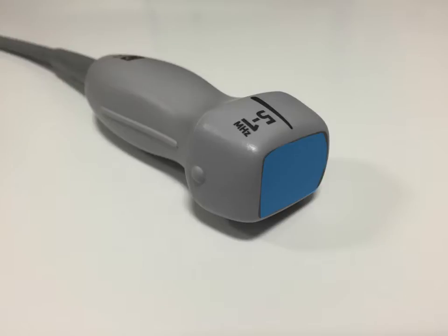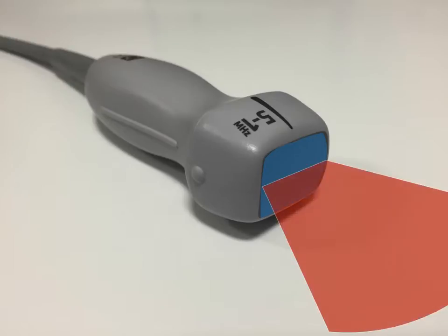So the way that these crystals work is they generate a nice beam. It's very flat and it's very thin, and you see that it spreads out. So it's pretty much in a sort of two-dimensional plane. And some people liken it to a wallpaper scraper, but you may not know what one of those are if you don't do things like decorating.